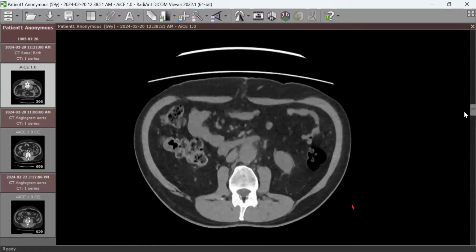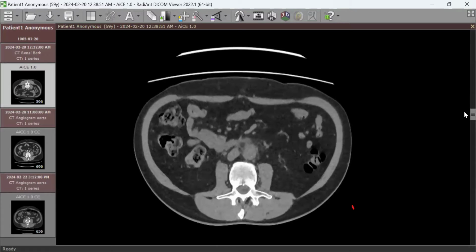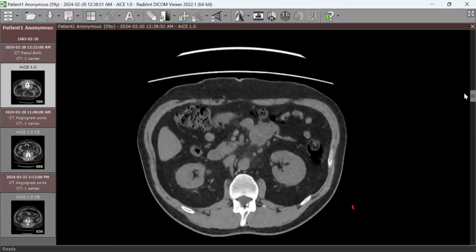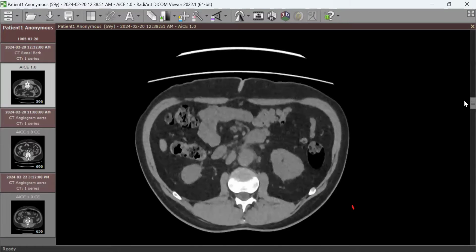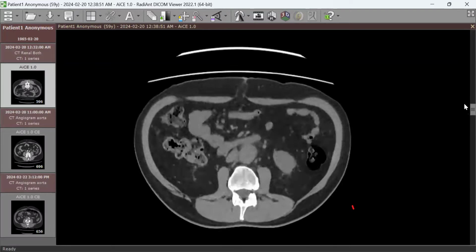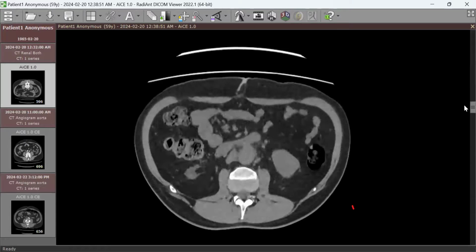What do you think of the diameter of the aorta in this region? Here it is large. If there is stranding and a lymph node around the aorta and a large aorta, we think of mycotic aneurysm. Okay, good. What's the normal diameter of the abdominal aorta? The upper limit is 25 mm. You're right. It's 25 in the upper part of the abdominal aorta, and at the bifurcation it is 15 millimeters. Between 25 and 30 is ectasia, and after that you go to aneurysm.